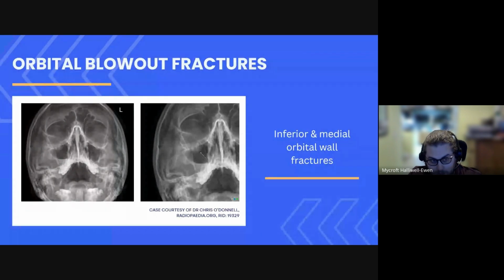The reason we worry about this, the reason it's kind of called a blowout, slightly dramatically maybe, is that inferior rectus can get trapped in here. Yeah, and then you get, you know, visual paresis, right? The muscle gets stuck, the eyeball gets stuck, and that's a real problem. It needs fixing. But you can just see the fracture, and you can just see this little soft tissue protrusion, which I think is probably showing us that it's inferior rectus herniating through that fracture, which is going to cause some issues with eye movements.